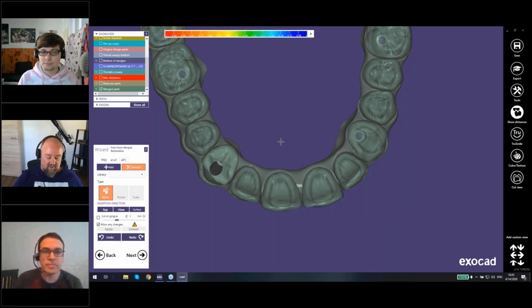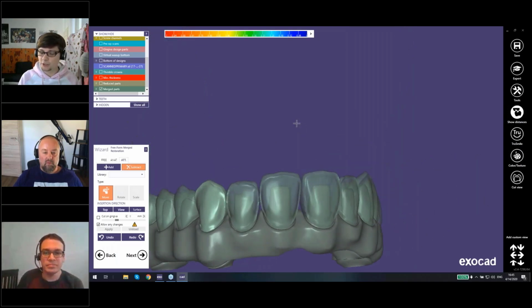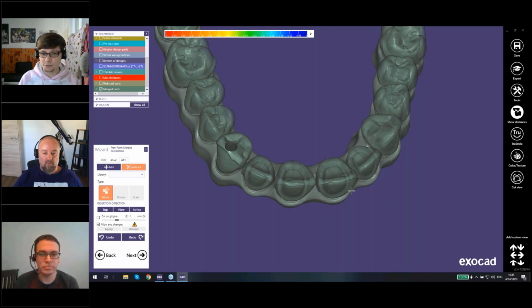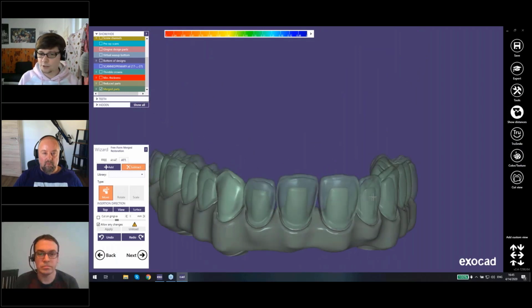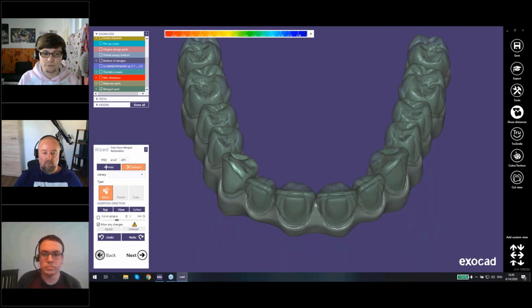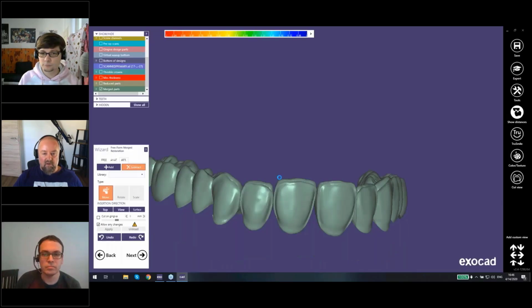Okay, so at the moment, that's a good question. Yes. At the moment, there's no option to really make sure that your thimbles are completely parallel, so you have to kind of just take a look at it. There is a feature in the works for the future where those thimbles also will be parallelized. To be quite honest, I've never tried out to create a bridge on top of the thimbles, but I don't really see a problem with that if I would go in the expert mode and connect them. Has any one of you two ever tried it? That should work. So I think you can even in the DB already connect it.